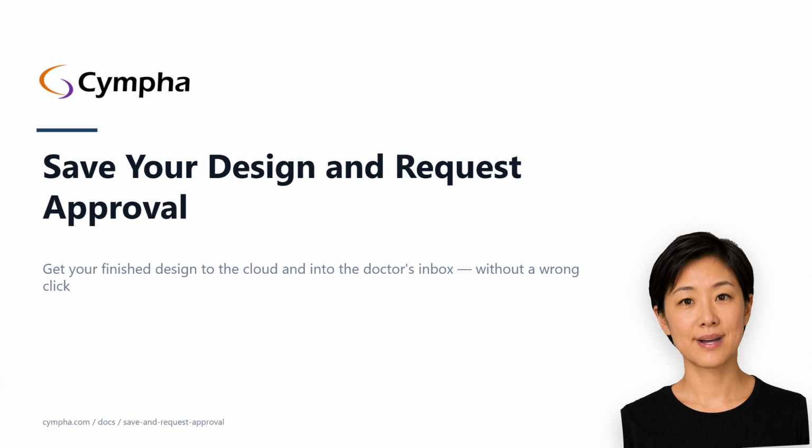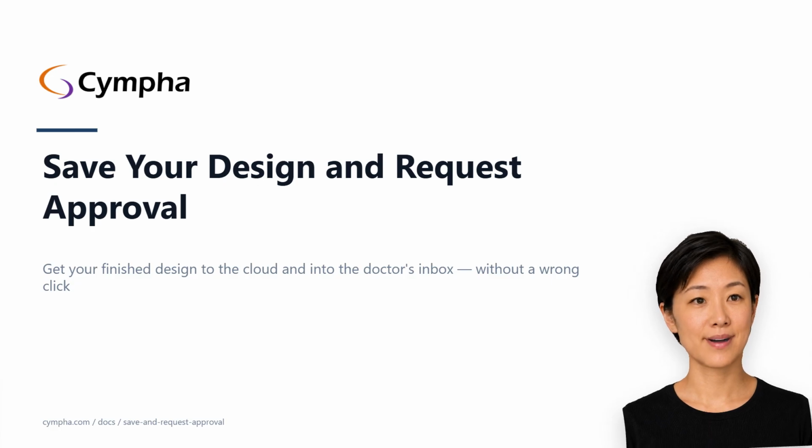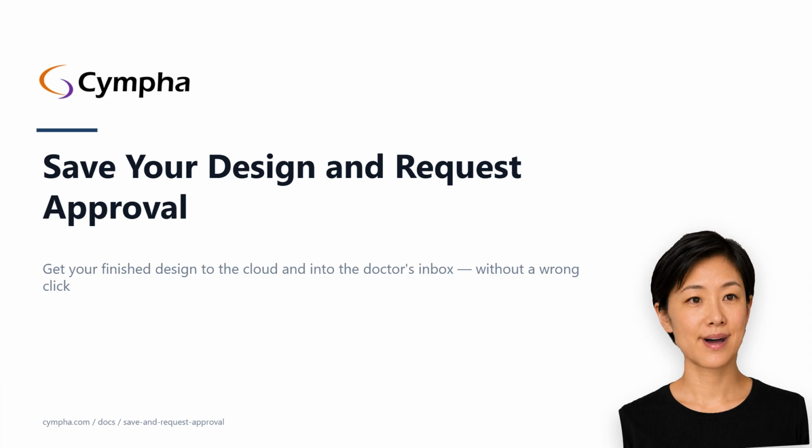3 prerequisites, and each one is load-bearing. First, a case in the status designing that you are the holder of. The request approval button only renders when both conditions hold: you're a lab-side user, and the case is currently designing.